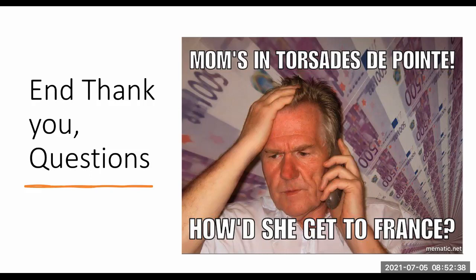Okay, but when you start analyzing any ECG, remember, go step by step. All right, and when you go step by step in that ECG, you get at least to the QT prolongation. When you get to the QT prolongation, then you start thinking about the differentials. And if you can't remember all of them, you just pull out your phone. If you don't have data, get 50 cents of data. It's more than enough to look up the list of QT prolongation causes. All right. And then you say, okay, I've got this, and this. And at the top of it, you even see hypomagnesemia comes up very often in QT prolongation because it's one of the most common causes.